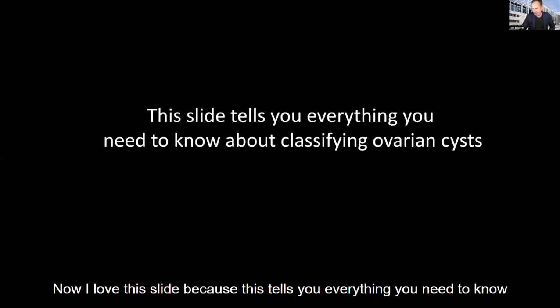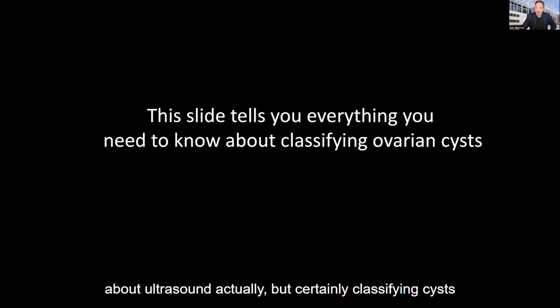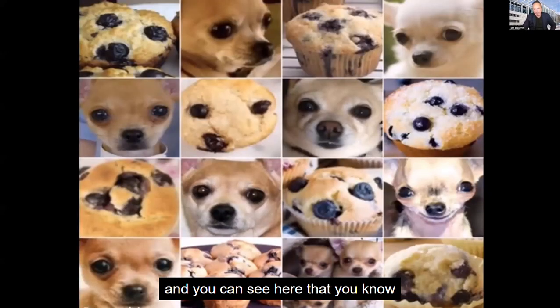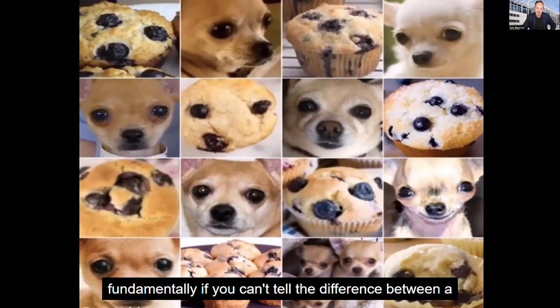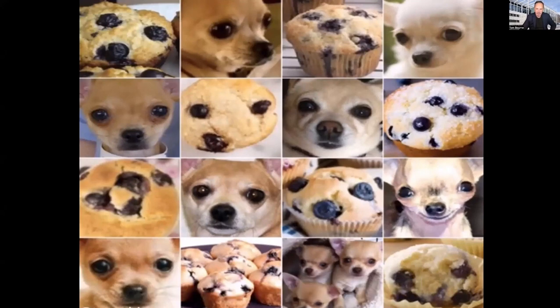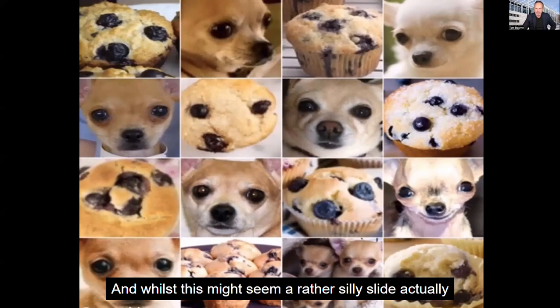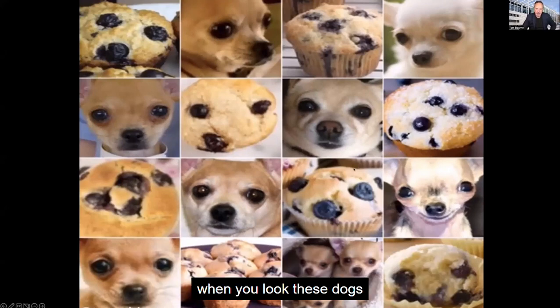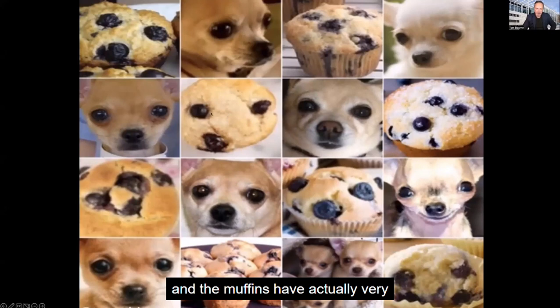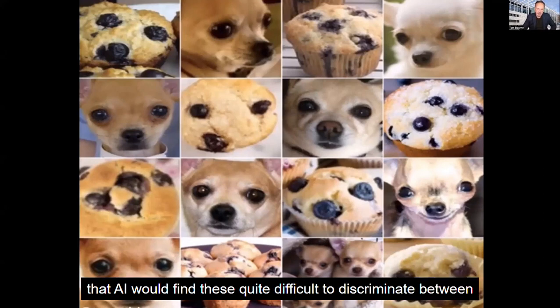Now, I love this slide because this tells you everything you need to know about ultrasound, actually, but certainly classifying cysts. And you can see here that, fundamentally, if you can't tell the difference between a blueberry muffin and a chihuahua, then you may run into trouble when you're eating your breakfast. And whilst this might seem a rather silly slide, actually, when you look, these dogs and the muffins have very similar features.